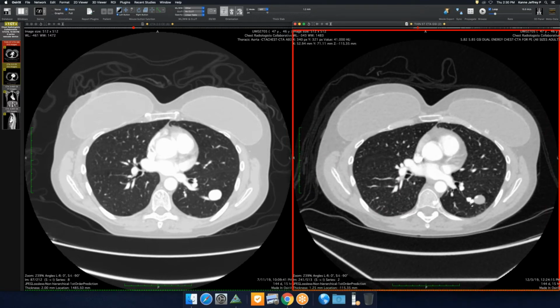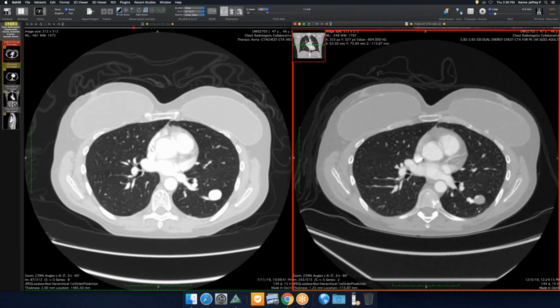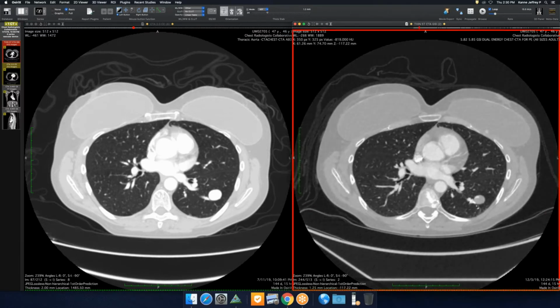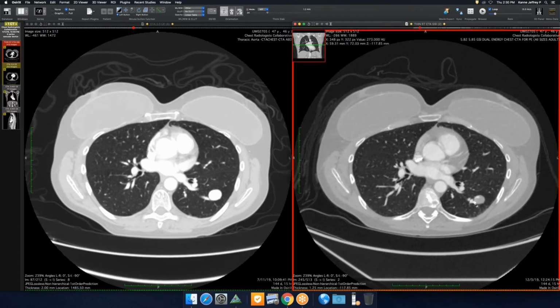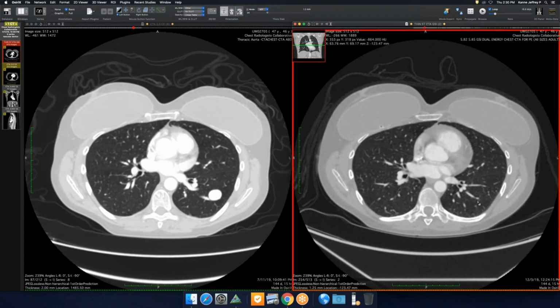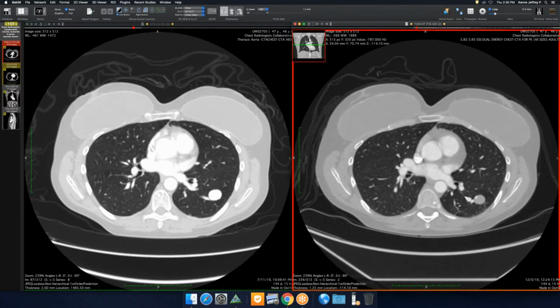I mean, at least for AVMs, usually they coil them. But this is what they used. And at the time of the procedure, there was no residual flow. So over time, there must have developed this endoleak. To treat this, you'd probably have to go upstream and drop some coils, but make sure that there are not any side feeders coming in there as well, because you'd see that the draining vein is still opacifying and going back.